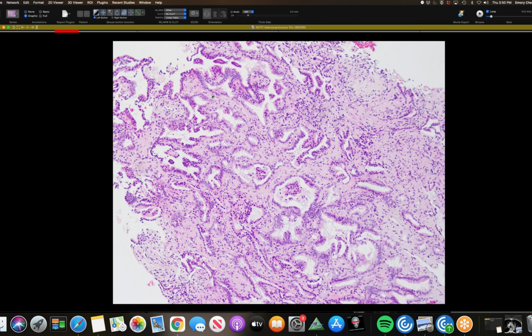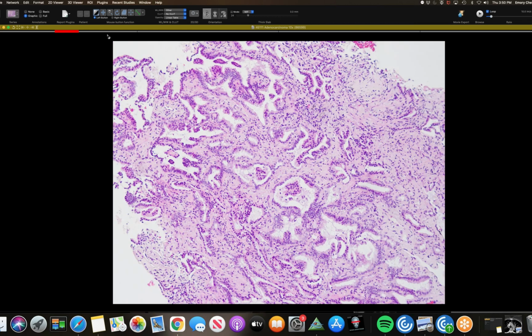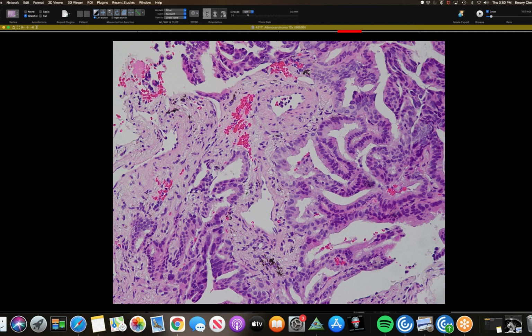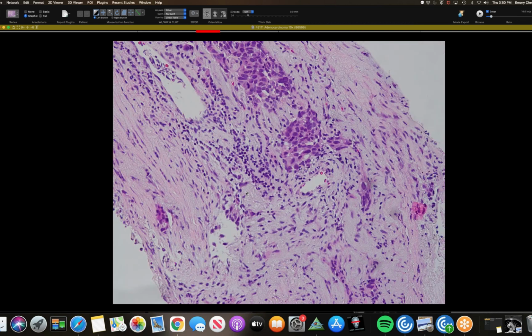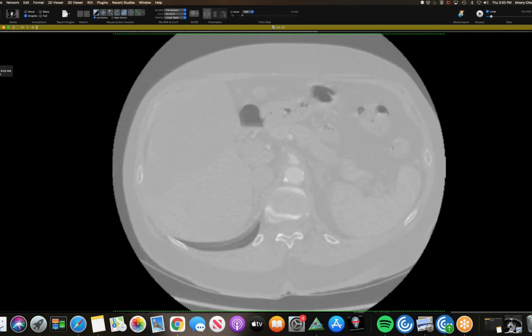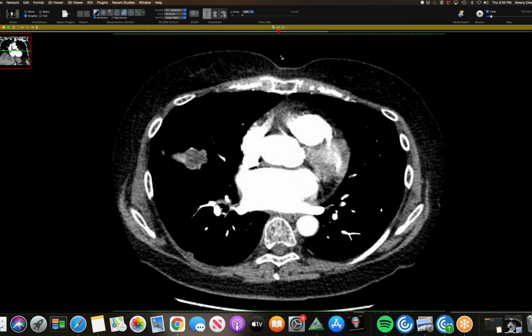and I'm glad I did that, because it ended up being a combination of lung adenocarcinoma, with an acinar and papillary pattern, and lipoid pneumonia as well. So this is the slide showing the lipoid pneumonia. You can see the lipid droplets here, and then this is the adenocarcinoma. Oh, that's really odd, the concurrent presence of those two things. Yeah, maybe it's a lipid-producing adenocarcinoma.